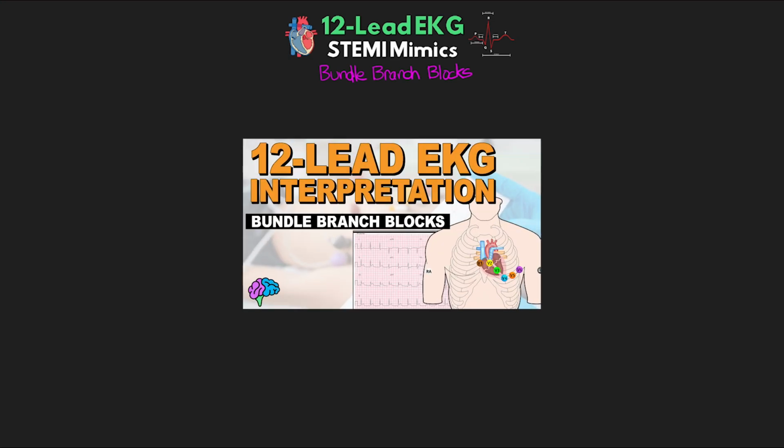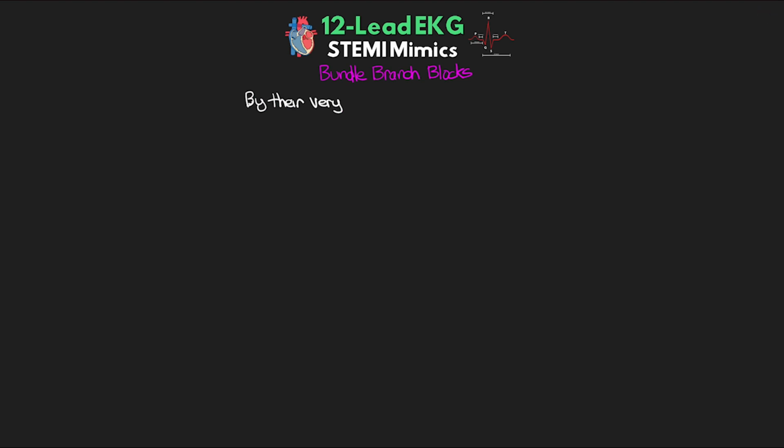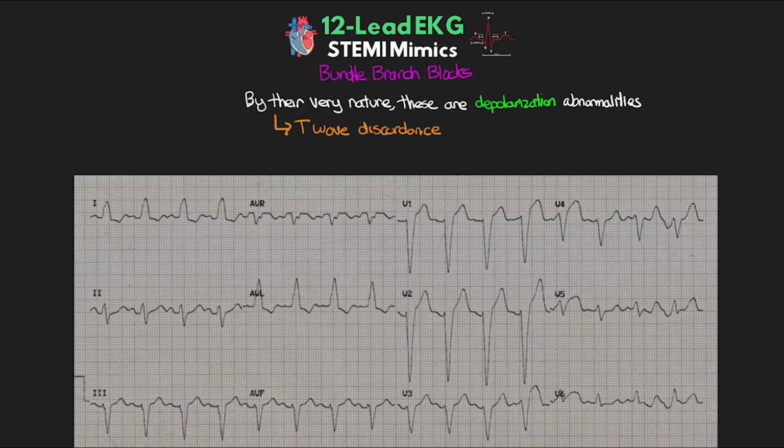Now moving on to our bundle branch blocks. Again, I already covered these already as well, so I'm going to link to that lesson too. But by their very nature, these are depolarization abnormalities, and with such, we'd expect to see our T-wave discordance. So in another example here we particularly have a left bundle branch block, which we can tell with the wide QRS complexes and the negatively predominant S wave in V1.